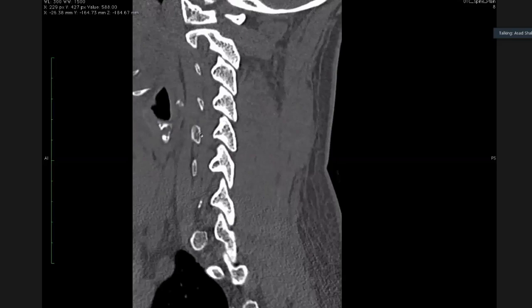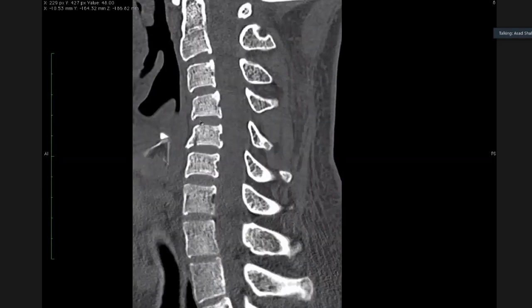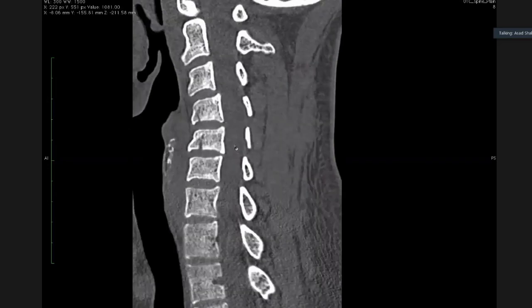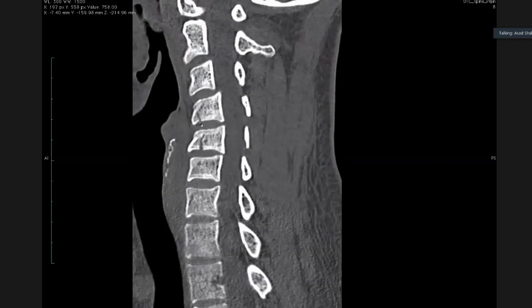But what about this fracture and probably a fracture here? So these are two kind of anterior-inferior. I think that's better seen there. So Eddie, do you know what's the name for these fractures? Anterior-inferior usually are extension fractures or flexion fractures. Considering there is no cast around the patient, I think that's a stable injury and it's extension teardrop and no disruption of the cervical lines is seen.